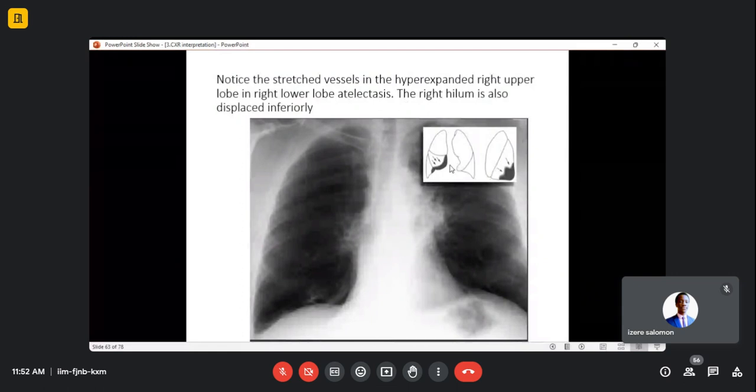There is not much rotation. If I analyze the mediastinum very well, the heart is normal in size. But there is something here. There is a line before I even leave the mediastinum. Why? What's going on?